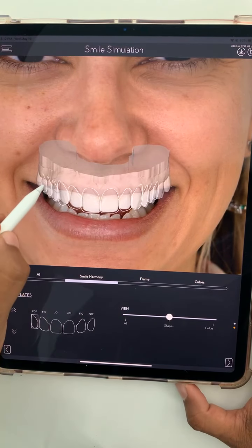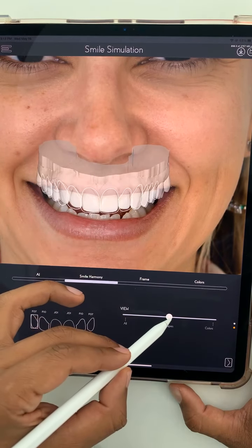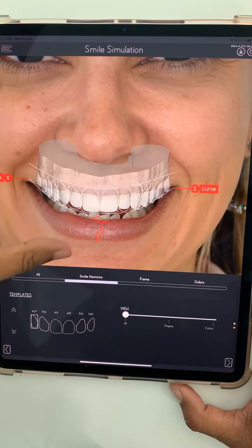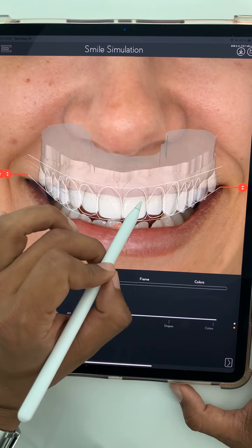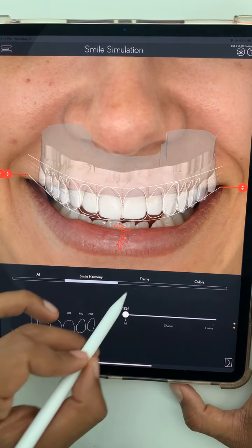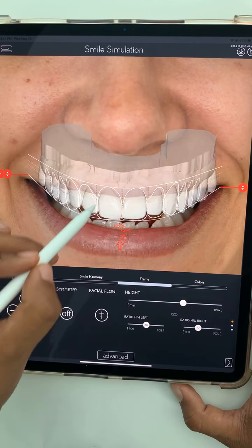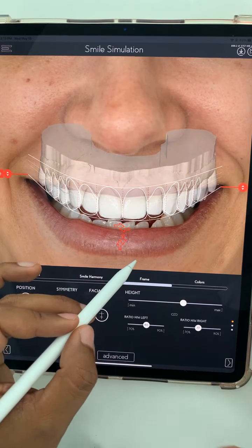Okay, so what is the benefit here? Now that I have my smile design in place, I have my patient's picture. With my STL, I am able to see my patient's gingival margins. So I'm not guessing as much anymore, because now I have a better vision of what's going on. South Africa, Spain, perfect, all over the world.